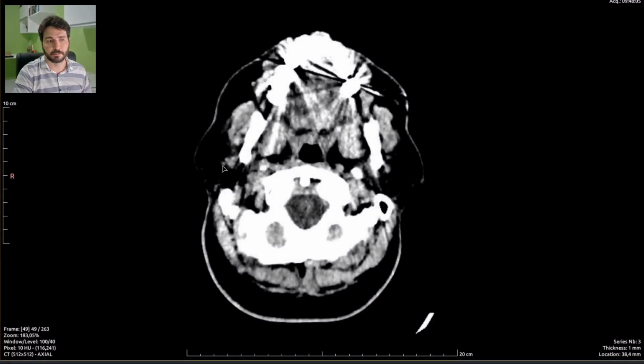Taking a little bit to load, but you know, we are 33 minutes in, everything looks fine, and this is loaded. This is a 58-year-old male patient, and he has suffered a hit to the head. This is a trauma patient, trauma to the head. So the exam has finished loading.